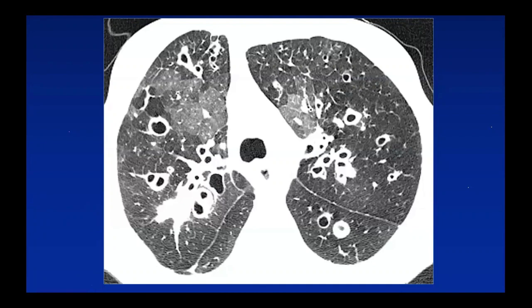Okay, let me talk briefly about this. In the normal lung, this is normal lung, by the way, 80% of the density is due to blood perfusion. What if we decrease the perfusion? It will become darker like this. So 80% of the normal lung density on a lung window is due to perfusion.